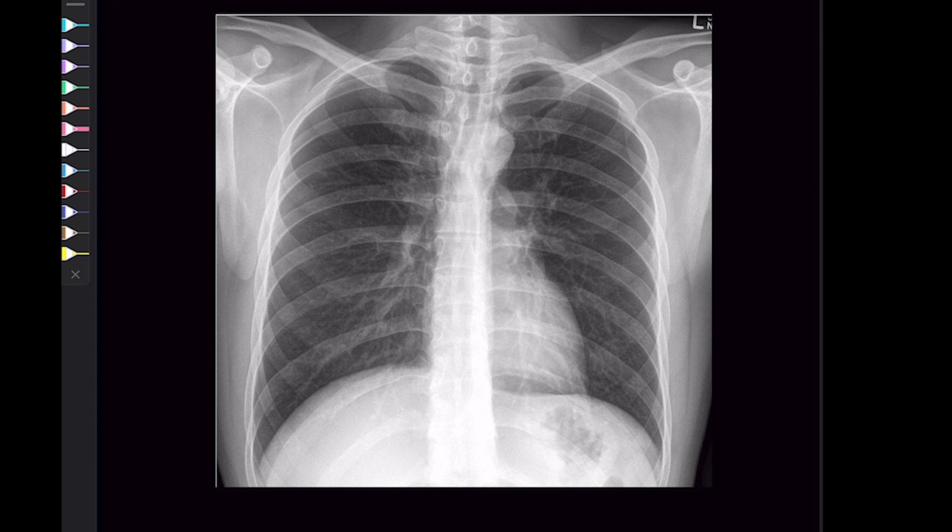We have to be systematic, and we should always look for who the person is, the view, and all other details, the date and the location. These are important points. After that, we should be looking into the quality of the X-ray, because quality of the X-ray is really instrumental and helpful for determining all kinds of diseases if they are there.